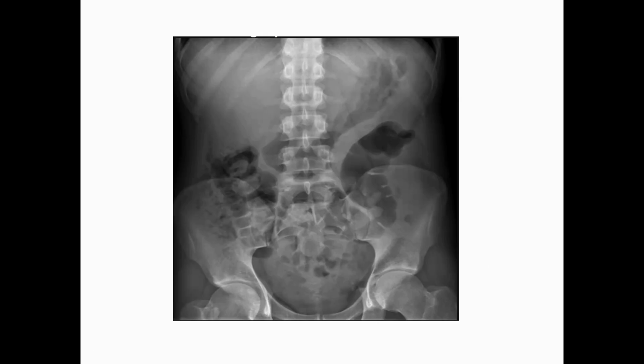So the anatomy: when you start reporting the abdominal X-ray, start with the stomach. This is the stomach. The normal stomach mucosa shows rugae. These are thick, irregular folds in the fundus and body. The rugae flatten when the stomach is distended after eating, drinking, or with swallowed air. Otherwise, you're going to see these rugae, but they will be flattened when the stomach is distended.